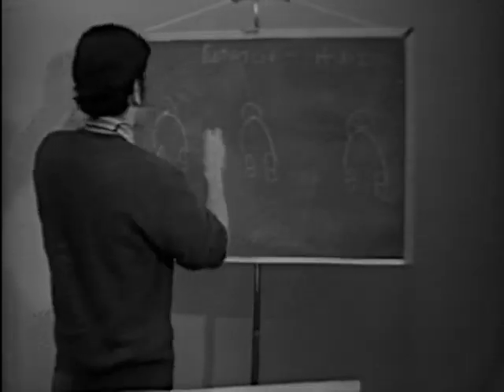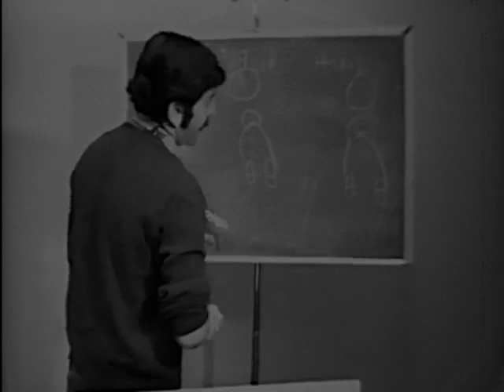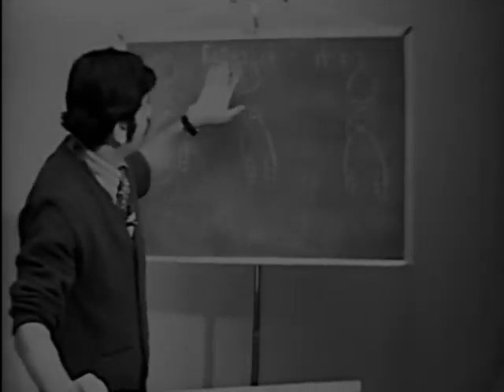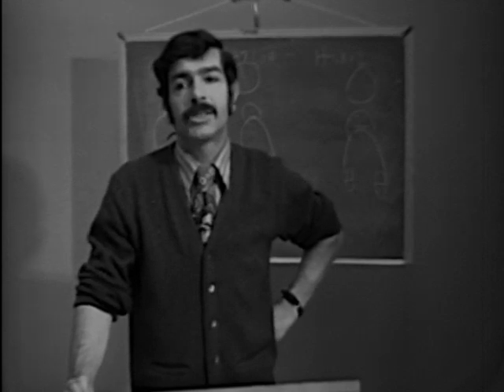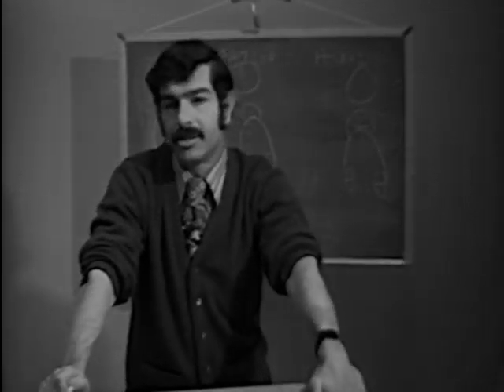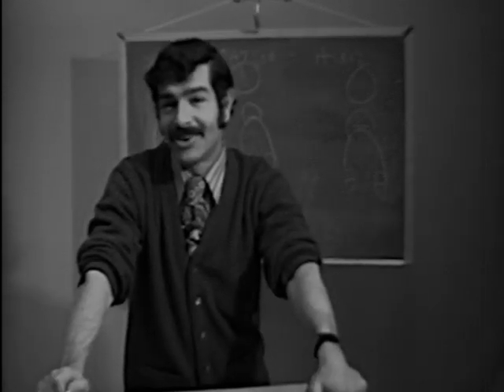Okay, and here's your clock. Let's say there's a clock over his head, right? Now, as I said, when you're talking about rotation, you look at the V leads. And what you look for in the V leads is the isoelectric lead. Now, what's normally the isoelectric lead in the V leads? Right, it's about V3 or V4.